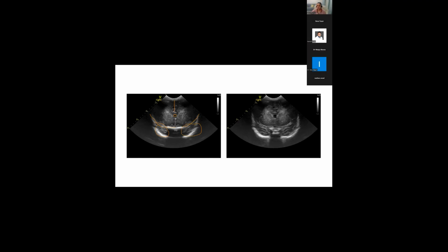So, once you start seeing some of the corpus callosum in between, is this the first image? No, it is not the first image. It's the second image. Just for your knowledge, there's an article that I've shared with you, authored and published in JoVE, and that gives the standard protocol. Their standard protocol is actually to start with the frontal horns. In this particular situation, because the ventricles are really slit-like and small at this point of time, what you can't see is any of the frontal horns. And we've actually gone between the second and virtually the third image.